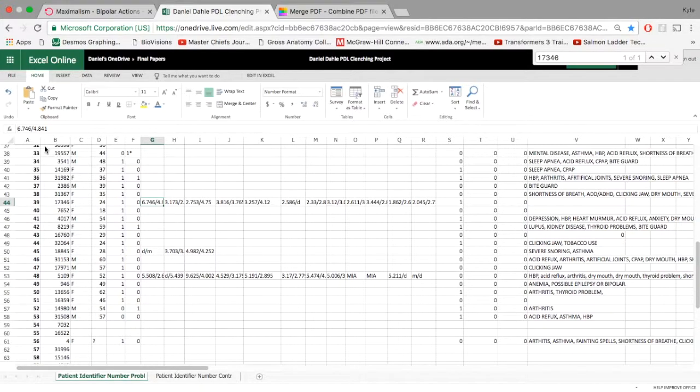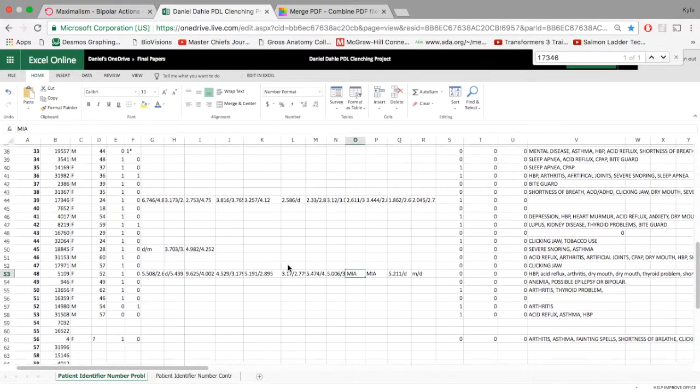Here's some of the information that's already been entered in. We're going to want distal mesial or mesial distal, and in this case distal mesial. If you can't quite get a measurement because of overlap between teeth, or you can't quite see it on the X-ray, we're just going to put that surface right there. In this case I was able to get the mesial measurement but not quite the distal one, so we're just going to put a D there instead of making a somewhat bogus measurement. You can see MIA in a couple places. We're going to put MIA for teeth that are missing.